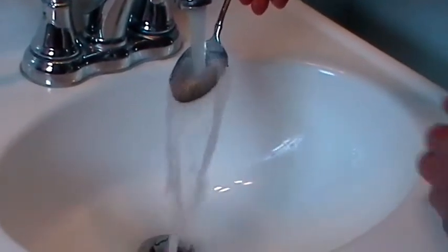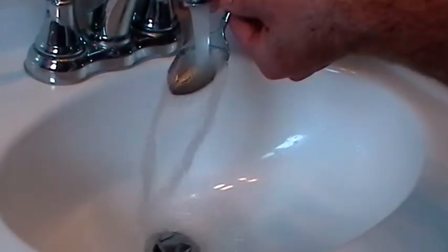So from our perspective, if we were looking at an apical 4-chamber view versus an apical 2-chamber view, you would see something totally different. And that's just the point of the example: to make sure you assess the jet from as many different angles as possible, because it really can look different and can affect your conclusions.